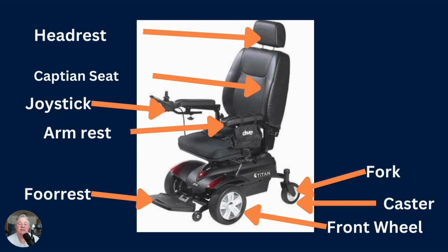Armrest, obviously, that comes from the car, so it's easy to remember. Footrest. Here I need to fix the spelling, but it's a footrest. That is an odd word. It doesn't matter the style, it's a footrest.